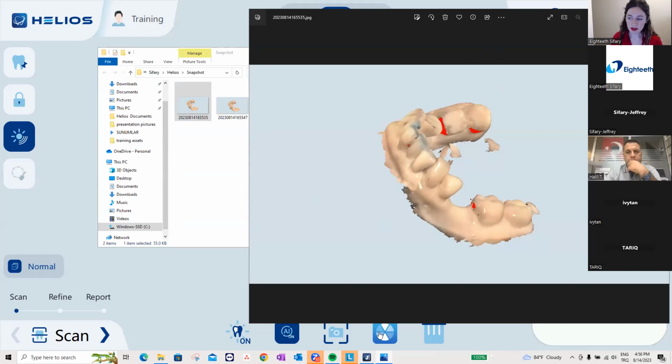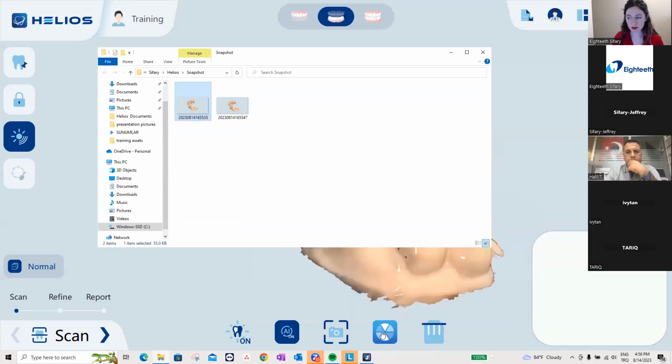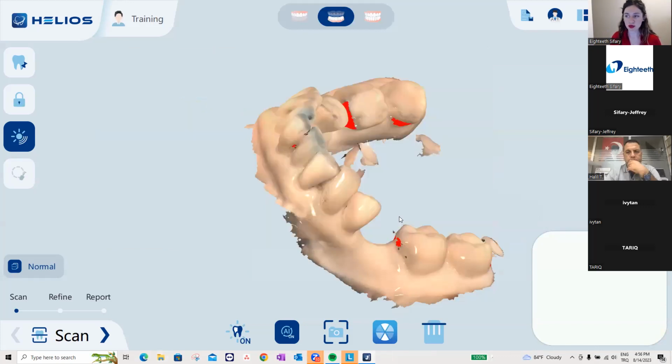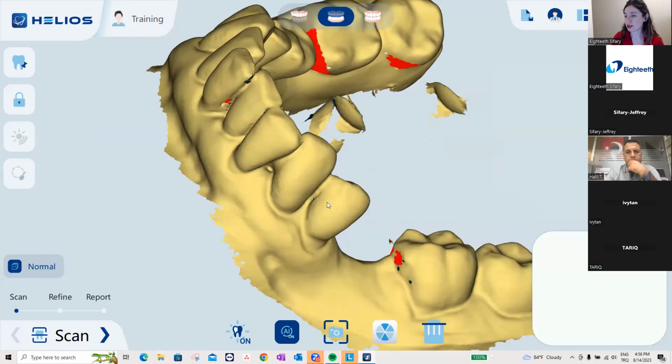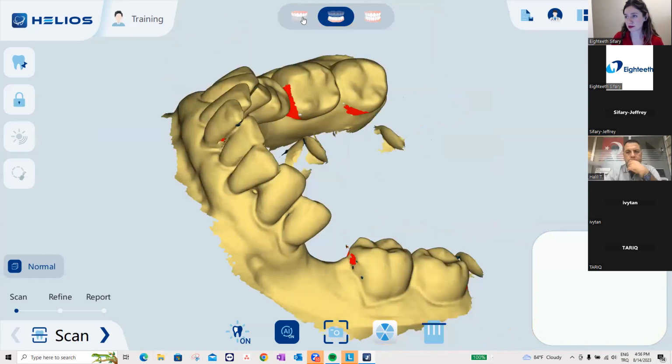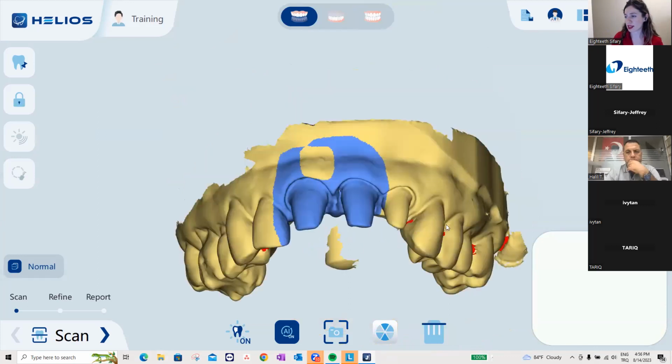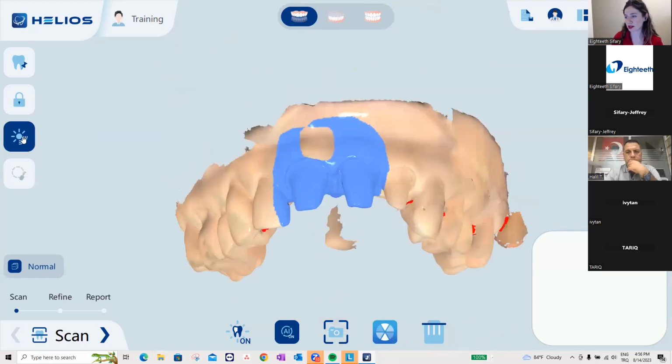And this one is color mode. I just mentioned that dental laboratories like to see monochromatic colors. And if they like to see like this, or like this, for this area, they can always take a look. Yes, you see, there are three modes, let's say.